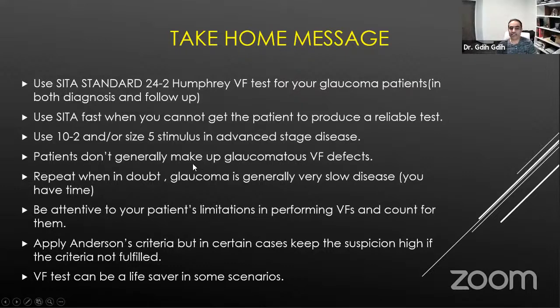Patients don't generally make up glaucomatous visual field defects. Those patterns that we looked at and saw in all these examples, a patient cannot intentionally make those happen. Those are a pattern in the RNFL, and if they are there, they are real, even if the test is not reliable. Okay. Repeat when in doubt. Glaucoma is generally a very slow disease. You do have time. So repeat, repeat, repeat.